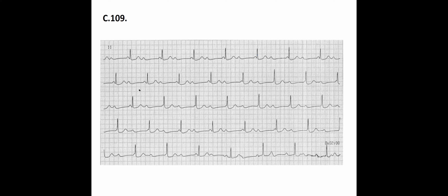And when we have a third degree, again it is rhythmic because there is no connection between the atrial and the ventricle contraction. And the ventricle escape rhythm is rhythmic. So if you had a high degree, that's arrhythmic. Third degree, rhythmic. In this case, we have an AV junctional block, a third degree block, but also an escape junctional rhythm. Yes, that's it.